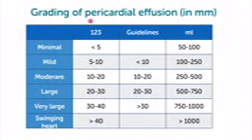And this is my little, I would say, suggestion to you, because the difference between these two grading scales is simply that we also define very, very small pericardial effusions as minimal and pericardial effusions which are huge as a swinging heart. So take a look at these different degrees of pericardial effusion, and here would be the corresponding amount of fluid that you can estimate to be in the pericardial sac.